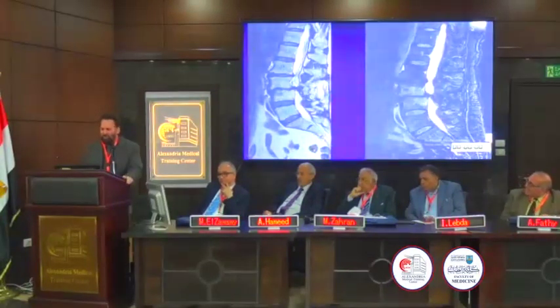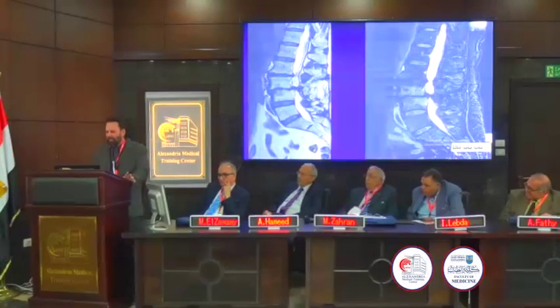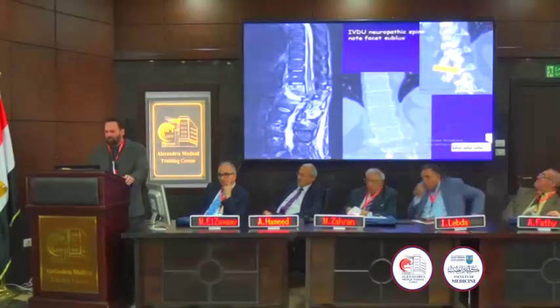This person has an atypical infection with an anterolisthesis, no fluid in the disc space, but marrow edema on either side. And this was a diabetic, so this is neuropathic spine, but could just be a degenerated disc. This is neuropathic spine. This was an intravenous drug abuser.